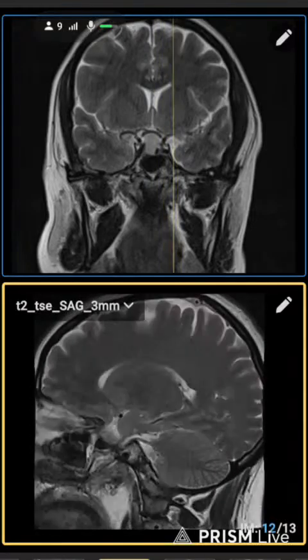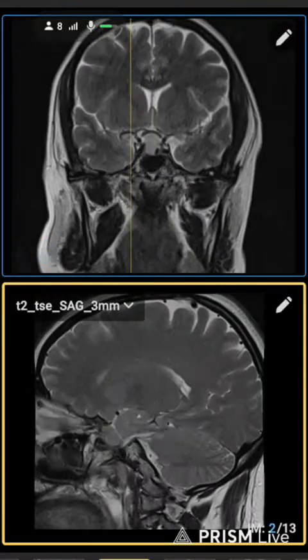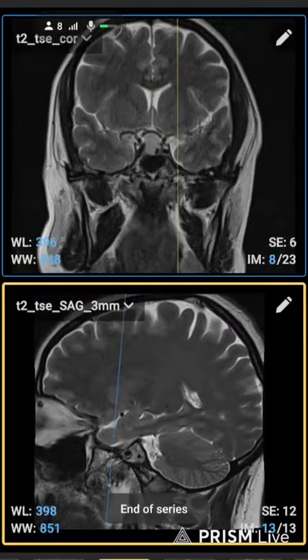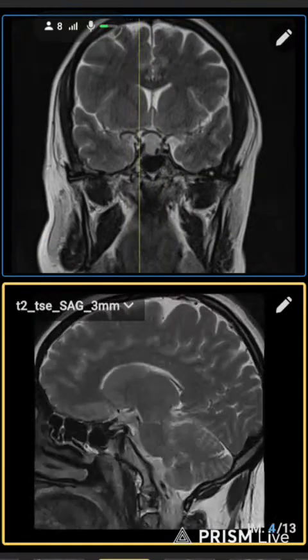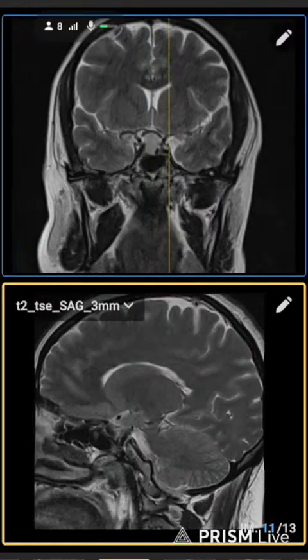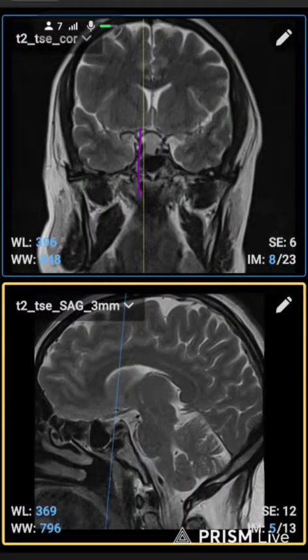Here you can see in pituitary brain you will add the slice. We take 13 slices, 3 mm sequence of T2 and T1 coronal. Here you can see we include the pituitary, starting from this to this endpoint.